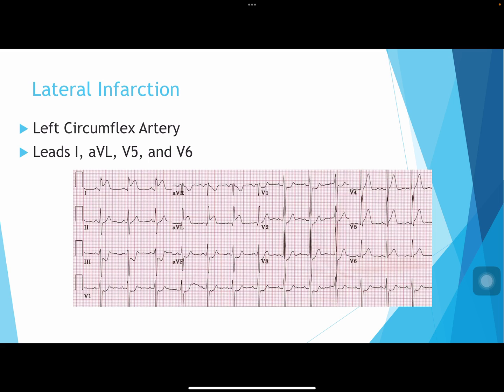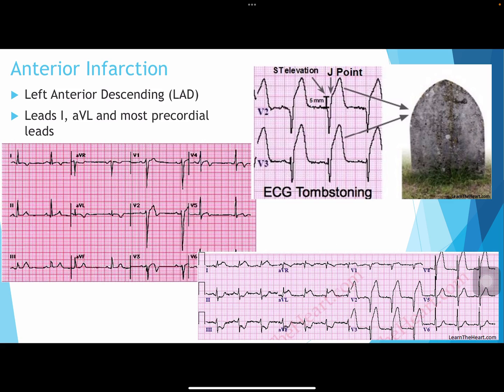You obviously will see that ST elevation that you're seeing on this example in this chart. So pretty straightforward with the lateral changes or lateral infarction. So if you go on to the next slide here, which is anterior infarction. So the LAD, you guys may know of it as the widowmaker, right? So that's the big kahuna.